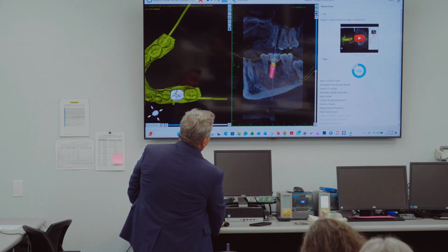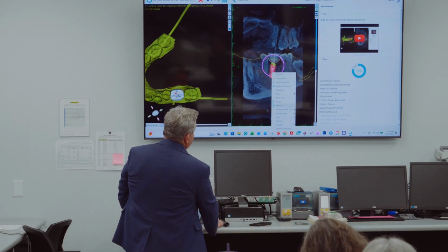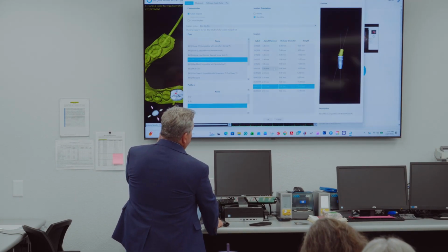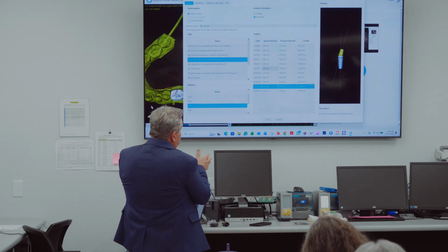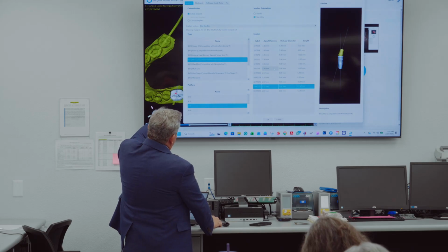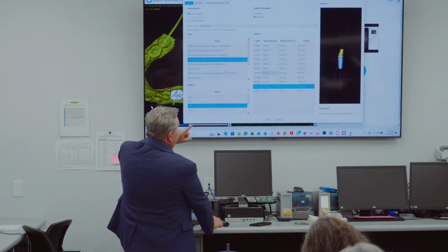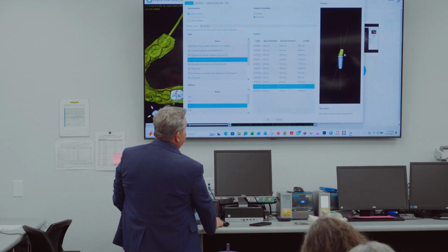So, if you wanted to go a different implant, you do the same thing. This is where you would replace the size. If you wanted a deeper or longer implant, which I don't know if you'd need, you could go shorter, longer, thinner, narrower, whatever. In that max line, you could choose a 3.5, 4.3, 5.0, 6.0, or even a 7. And remember, there's only one restorative platform, so they're all NP platform. This is a good example of what Corey is trying to explain with the platform shifting.